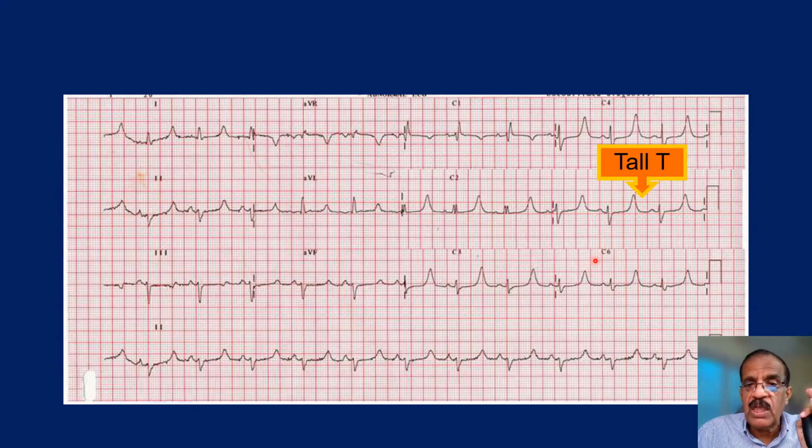I told you there is something which shows changes just like hyperkalemia, but it is another electrolyte abnormality, calcium, hypocalcaemia. Since calcium and potassium are physiological antagonists, hypocalcaemia would show similar ECG changes, not exactly all of them, but some of the changes are just those which we see in hyperkalemia.